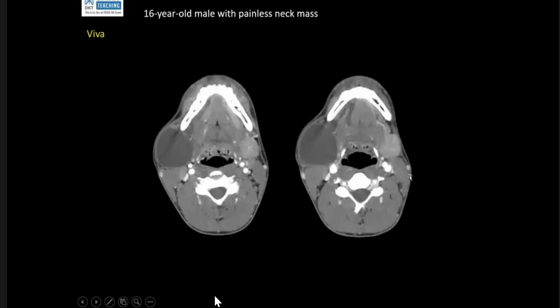Likely, because it's a cystic lesion and looks benign to me, it represents a branchial cleft cyst. Hint: look at the sublingual space. Yeah, I can see that there is dilatation of the duct as well. So is it the duct? You see this and this?